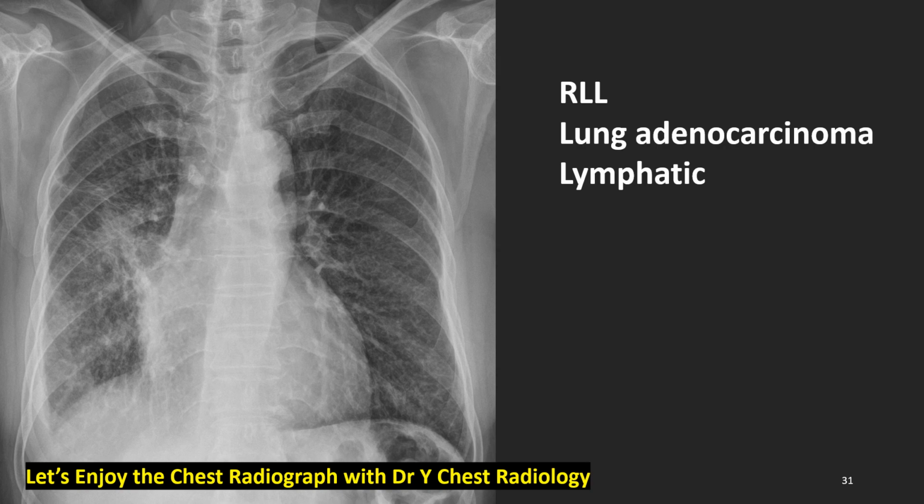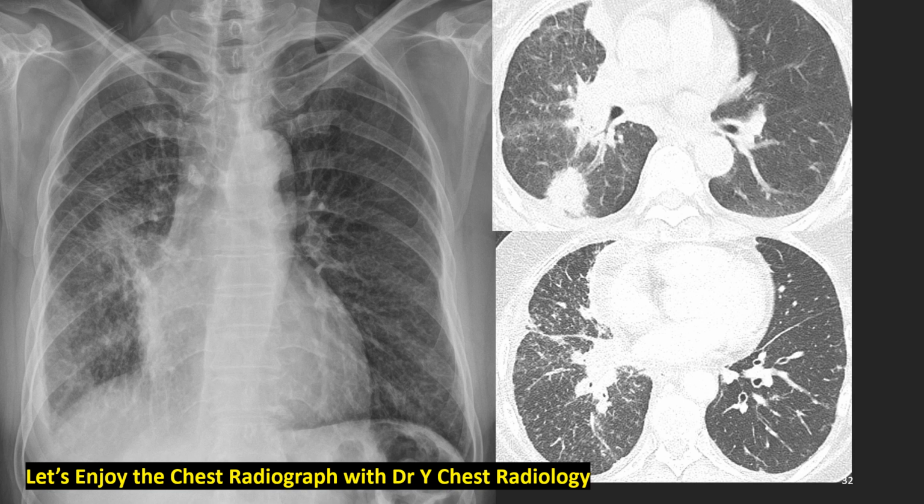What about this frontal radiograph? Please look at the distal trachea on the left side. You got it? The right distal side looks okay, but the left distal side is not looking okay. Yes, bulging mass here. What is this? Distal tracheal tumor. How about this case? This one is a mass, lung cancer.